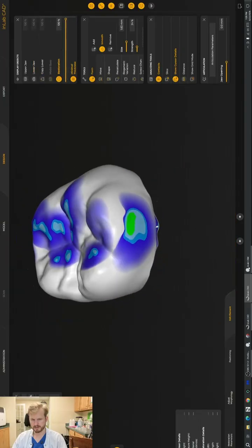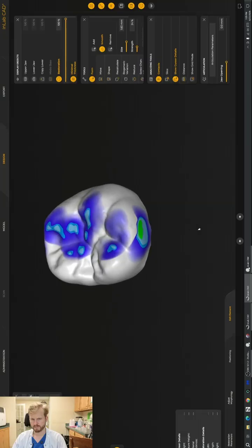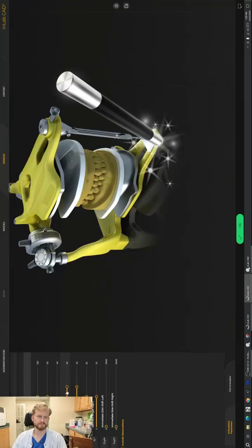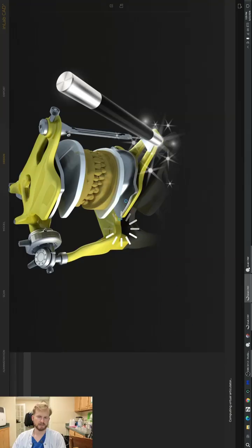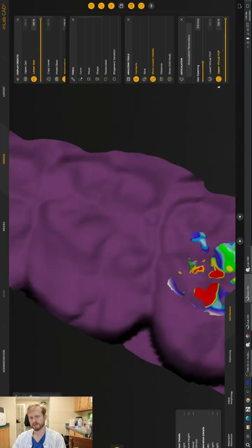May increase this lingual dimension here, give us a little more of that double turquoise color. Good. Check the articulator. It's generating a functionally generated path. This will show us excursive movements when the jaw moves left, right, forward, and back, so we can remove any interferences. There are none.